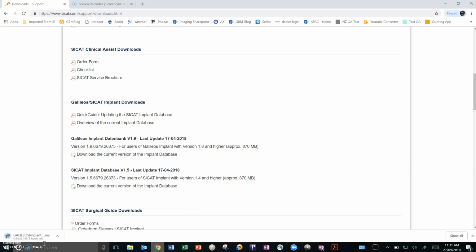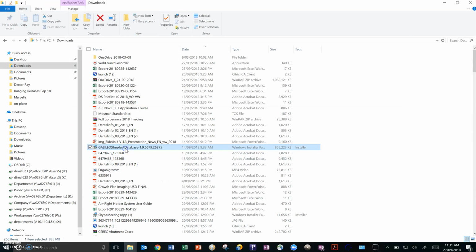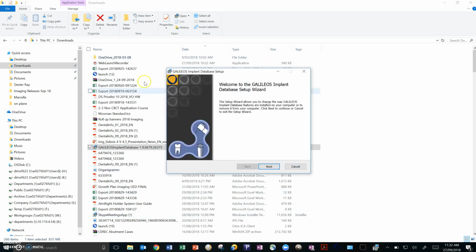So I would recommend to do that overnight, like starting at the end of the day or starting at the beginning of a day, but it might slow down the computer slightly. I already downloaded this version a while ago, just because we won't wait for it to be downloaded in this video. It can be found in the download folder once it's finished, and we can then select that file in the download folder, and it will open up the install process.